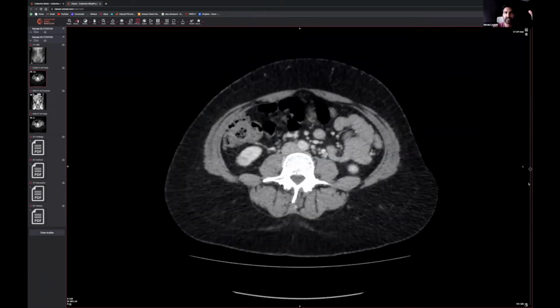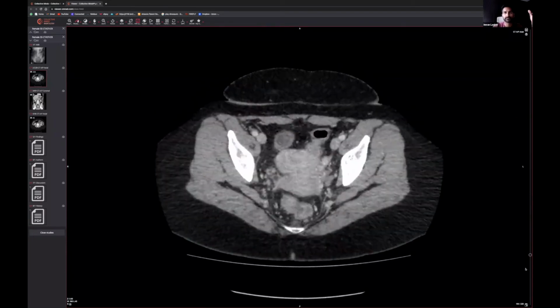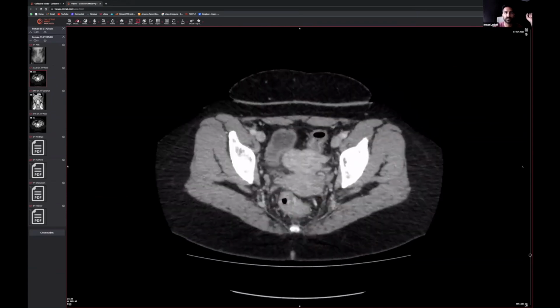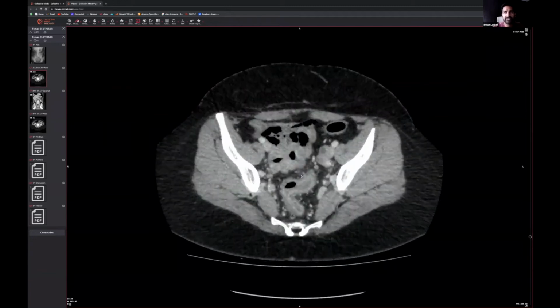And then after that, you want to be looking at the bowel. And then you kind of got to do a little bit of legwork to look at the bowel. So if we look at, say, as soon as we start on this bowel, hopefully people can see this, yeah? As soon as you look at that bowel, you can see that the bowel wall looks a little bit hyperenhancing, looks a bit strandy along the outside.